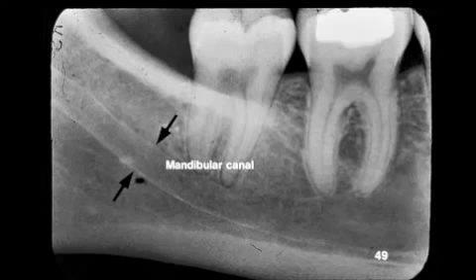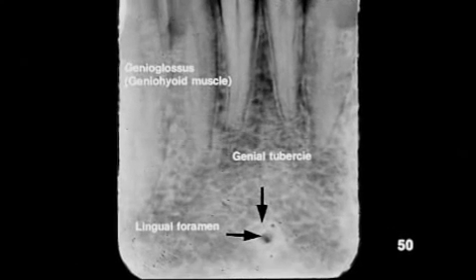Between these arrows is the mandibular canal. It is radiolucent. It has a white outline because it is surrounded by hard, compact cortical bone. Above the arrows, we see a bright white landmark. That is the external oblique line or ridge, which we have observed previously. Below the mandibular canal is the lower border of the mandible. It is radiopaque and is also observed on this slide.